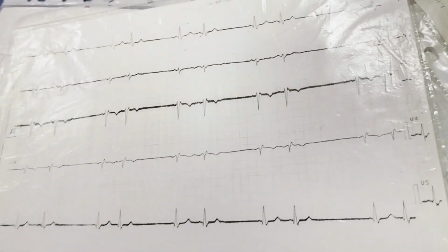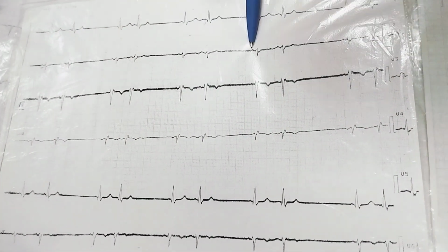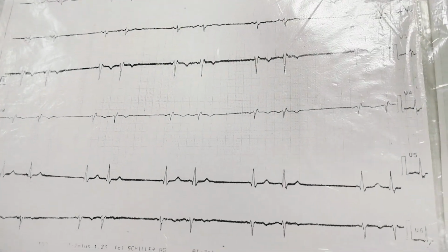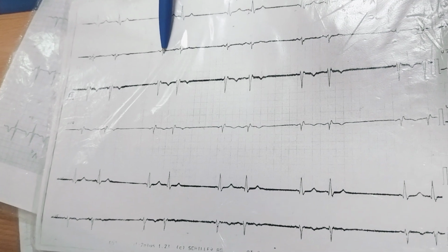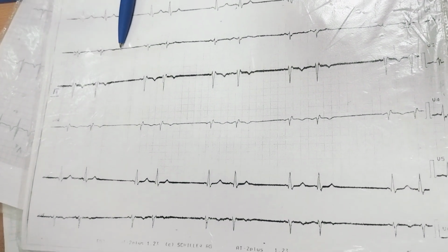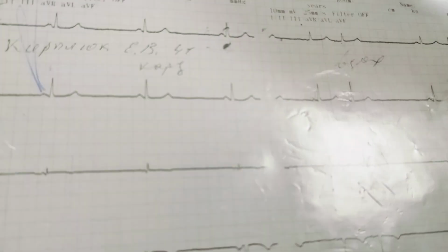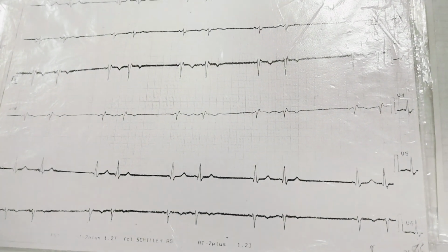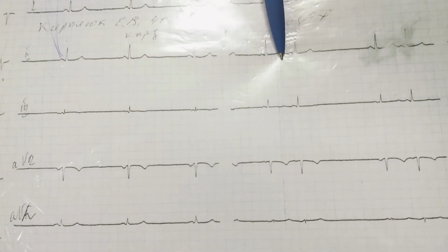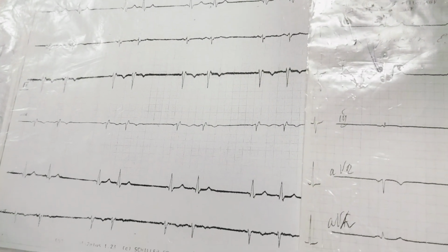Okay, this card. There is arrhythmia. P waves are present everywhere, so the arrhythmia is with a sinus pacemaker. Let's check next. If we take this distance, we are able to put it twice here, so it is SA block. Before, we had a normal distance; this one is abnormal. Only against a normal one can we compare. In difference from the previous card, where this distance is shorter than normal, here this distance is constant, this one is normal, and it repeats again and again.